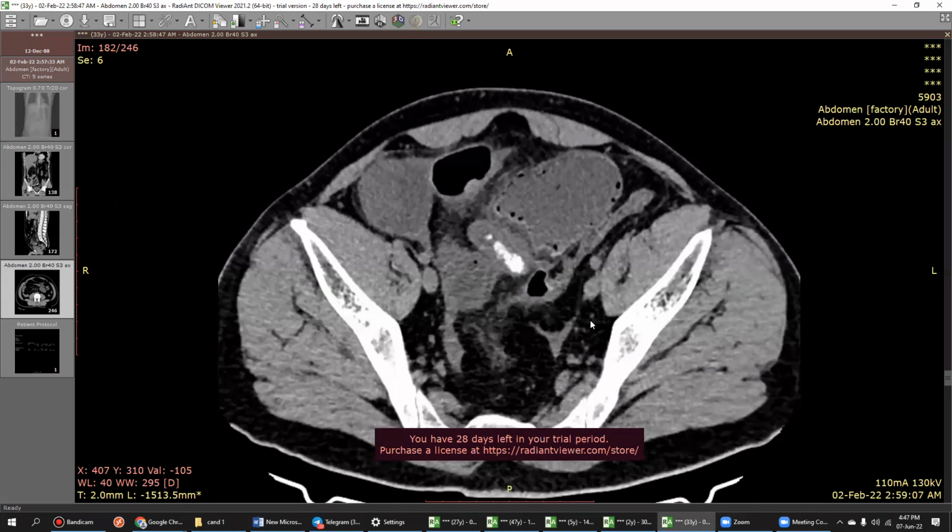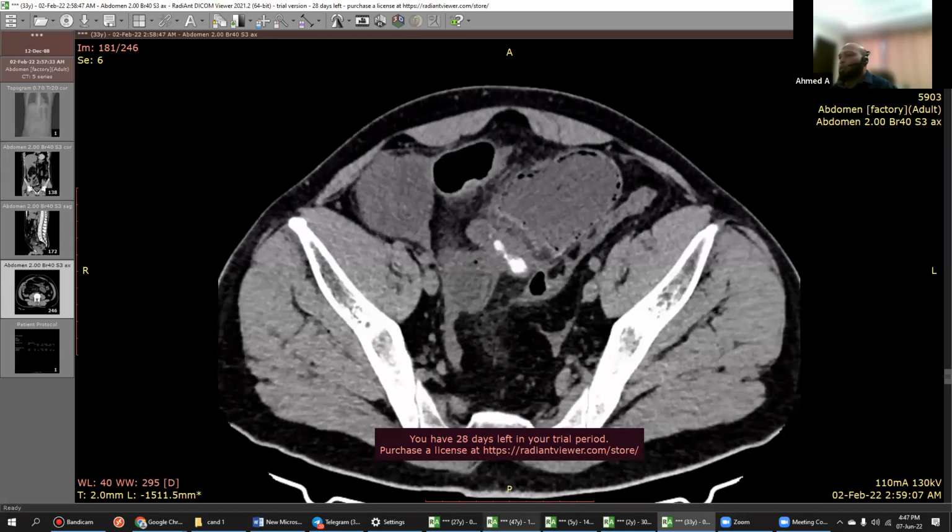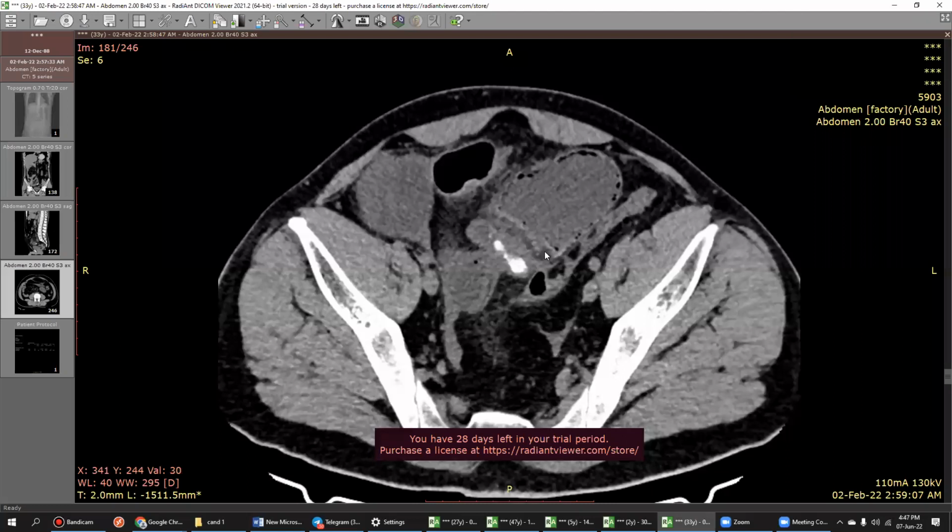I mean, no, you can measure it, right? You can see it. You can just put an arrow. Okay, that'll help you. Just a second, just don't move the arrow. Okay, now you can see the values like 200, 400, here on the left screen. So that's a calcification. Okay, so that looks consistent with calcification.